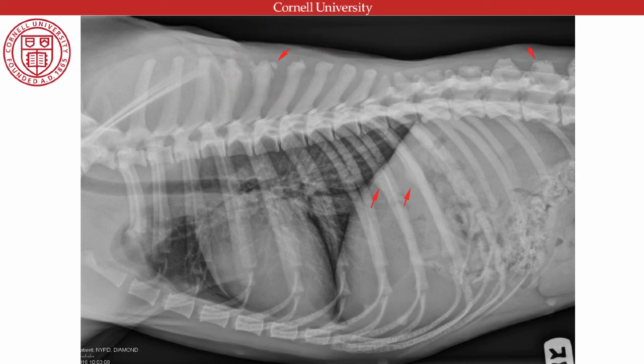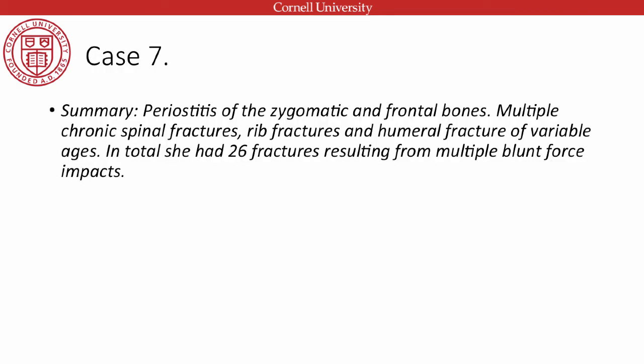Yeah. And when you do a CT of these guys, the CT looks like this: the spinous process is sitting here, the muscles on either side coming up, and they come to the tops. So I would say it's a blow to the dorsal aspect of the vertebral column. Yeah. So she was a prosecution case.